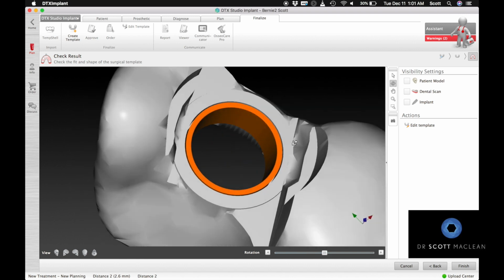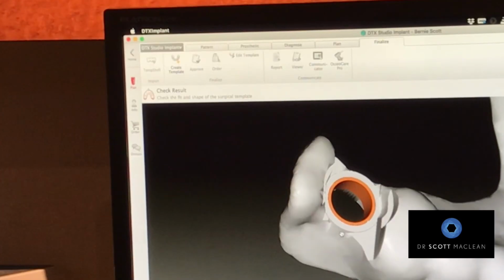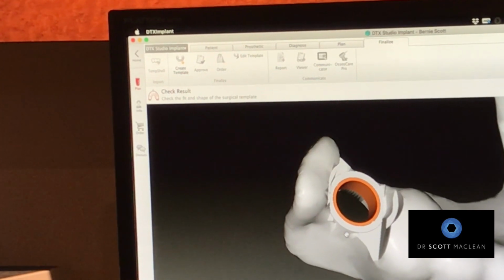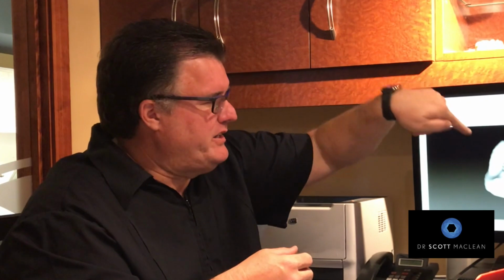How long are the drills above what the normal length is? Plus 10. Because we have 9, plus we're going to put a 1 millimeter drill guide on top of that, so that's 10. So this is going to be 9 back. When we put the implant in, the mount's going to carry it down 9 millimeters. But when we're doing the drilling, we have an extra millimeter because we're putting different guides in to angle the drills and keep them on target. So that's kind of how we plan it.